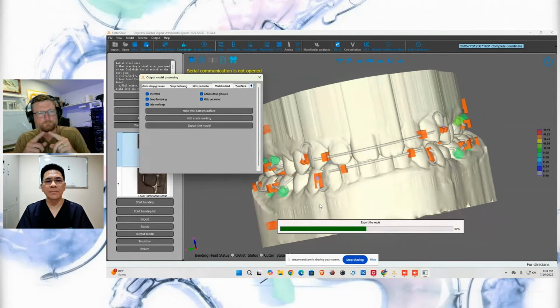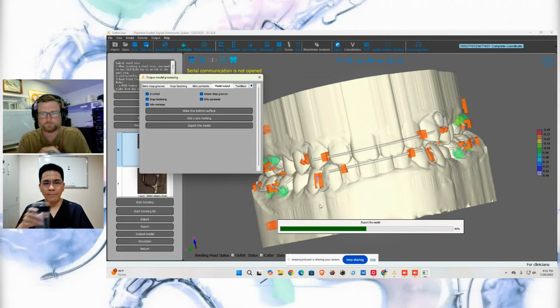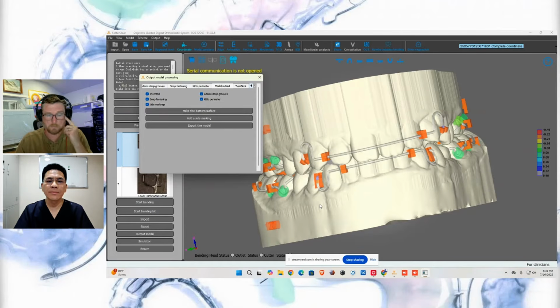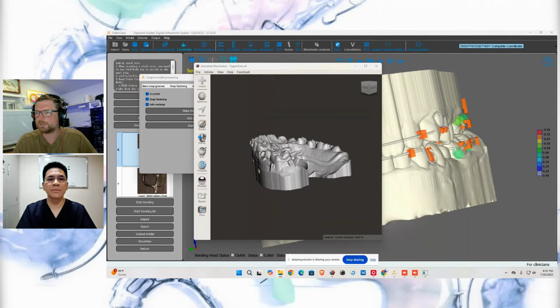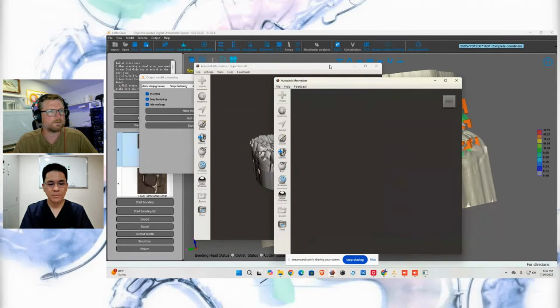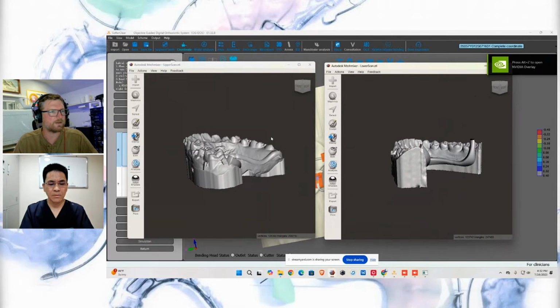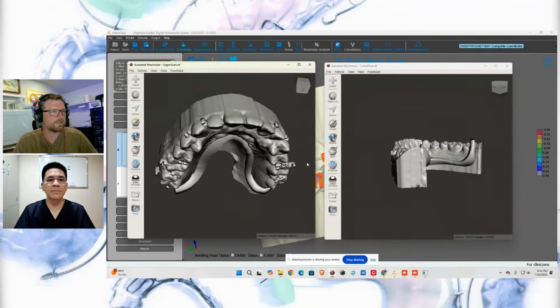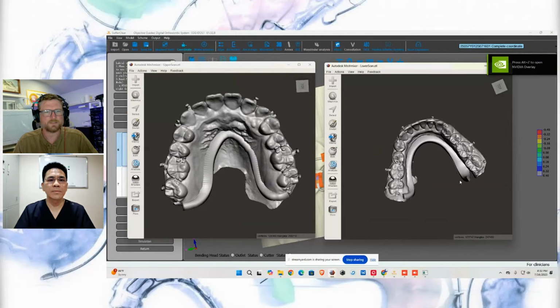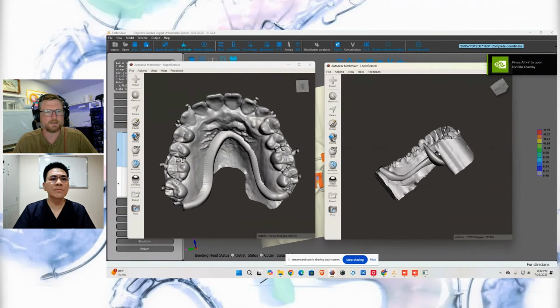When I was playing with this before, I just had one model showing, and I did export, and it only exported one model. So this is adding all the... There we go. Let's see what it looks like. Okay, it's finished. I got 2 downloads on here, and there are the 2 models. There's the fence and all the attachment clasp, and there's the fence for that one. Oh, the fence got a little messed up.